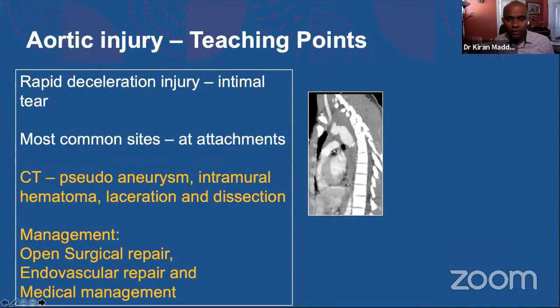So what are all the teaching points which you need to know is I already showed you one nice radiograph. Be aware of what exactly is a mediastinal widening. Even if you may be going into radiology or you may be going into a clinical team, if the radiologist is still working on his images, and if you suddenly notice a radiograph where there is mediastinal widening, hey, can you look at this radiograph?